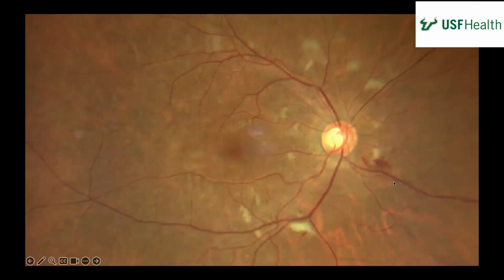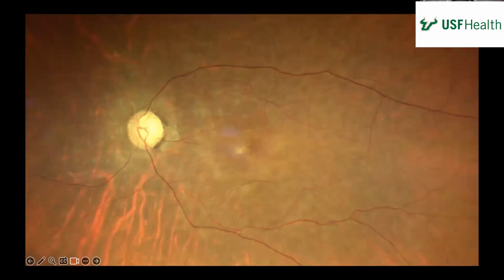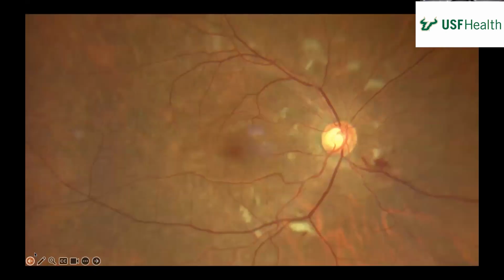Are you able to see my mouse if I circle? Okay. So I don't really have anything to add to that, just some hemorrhages, looks a little intraretinal there, and then all those white spots around the disc and the superior and inferior arcades. It's interesting, if you guys have a really good memory, last month, when I was lecturing on retinal anatomy, we talked about why the cotton wool spots form exactly where they are in this picture. They tend to circle the nerve in this funny pattern.